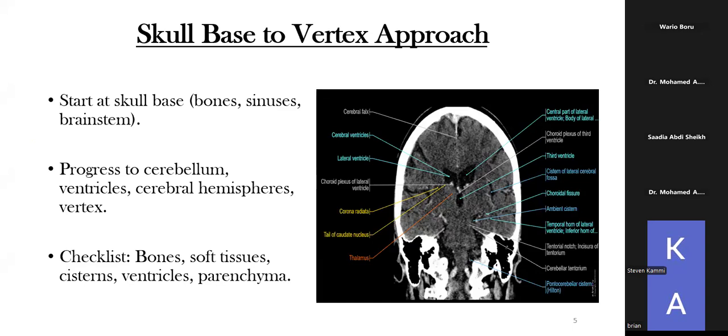Okay, so let me just minimize this. So I was just showing you that this is a coronal image that we have. And again, it's looking at the skull base. Let me just remove my phone from the meeting. Okay, good. So now I hope we go without any hitches.